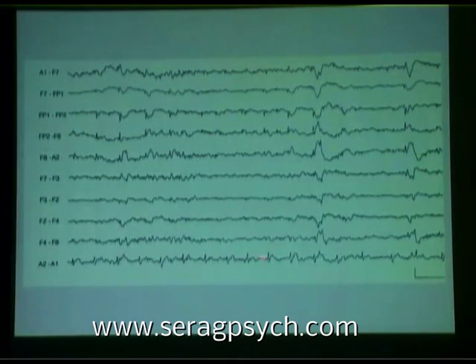This is the ECG down here. Sometimes, whoa, wait a minute. Hey, wait. That's a toughie. How much of that's ECG? Maybe that is, and maybe that is. Some of those might be these spikes. I guess they're not, though. That's close, eh? It'd be better to just have an ECG lead here.